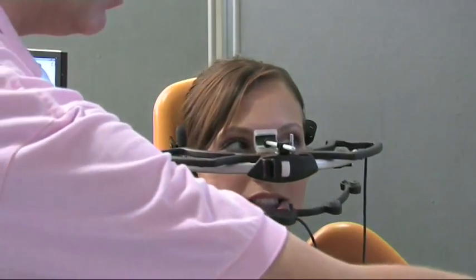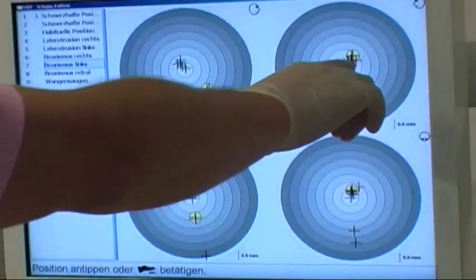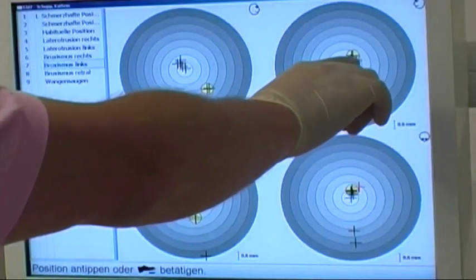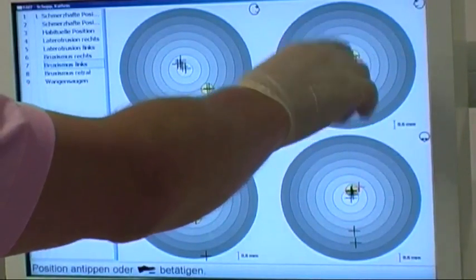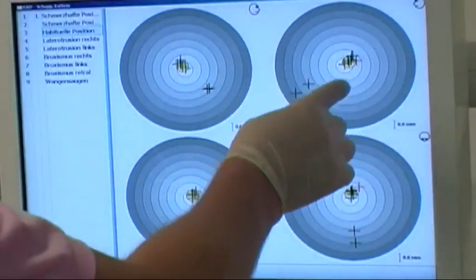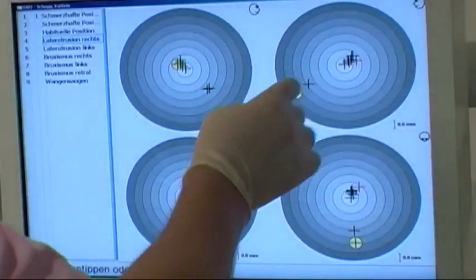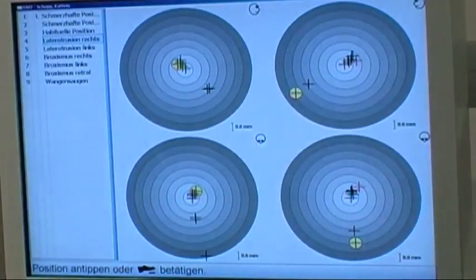Now I can show you where the most interesting movements were. Red indicates where your pain is. If you go over to the side, you will see circled in yellow the position of your condyle. If we start from the first result, when you were biting down, all other findings show that the yellow is further forward than the red. When you move to the right, the yellow is some distance away from the red. That is not too significant.